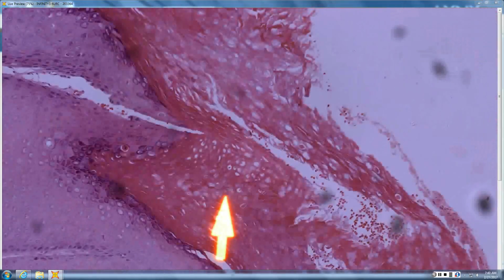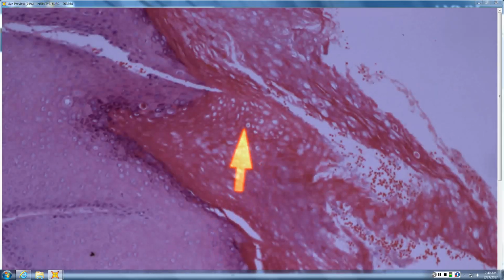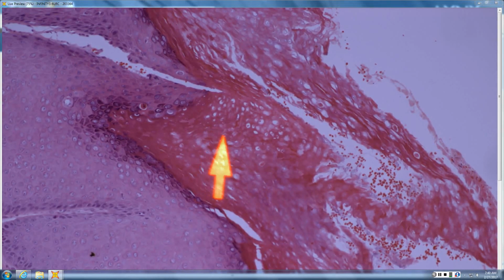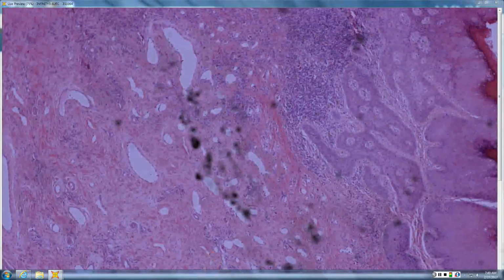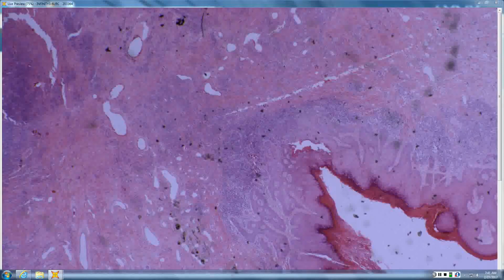Is good. So there's a warty stratum corneum here. So warty corneum, and in this case, it is compact but has little holes in it, forming a coarse basket weave. Looks like someone has taken a tiny little punch and taken tiny little round holes out of a red stratum corneum. Okay. So I would think that this is mostly wart. It's got the koilocytes there. Absolutely. And where do you think we are, this highly vascular tissue? We're on the probably leg or genitalia area.